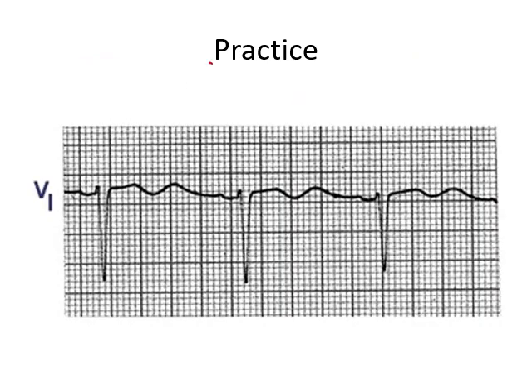Alright, let's move on to the next ECG. Let's look at last ECG for this lecture. So in this ECG, I want you to start marking the waves. This is a P wave. This is a small positive deflection, that is R wave. This is the large negative deflection, that is a S wave. This is a T wave. And this wave that you are seeing immediately after T wave is a U wave. Then again, this is a P wave. So U waves can be slightly harder to identify, but once you get used to reading the ECGs, you will be very comfortable in identifying them.